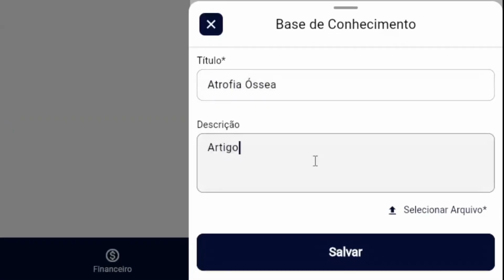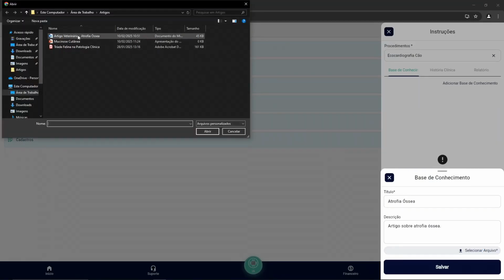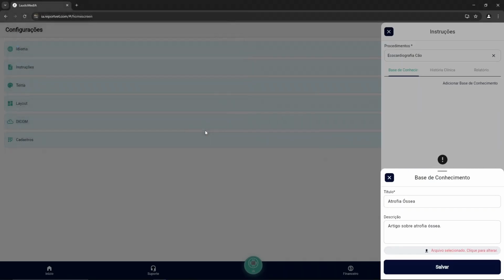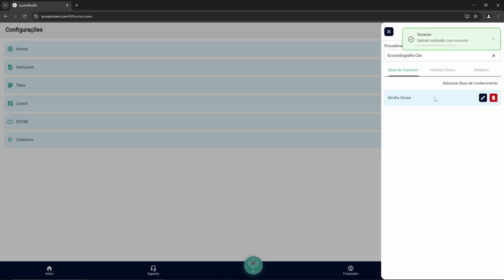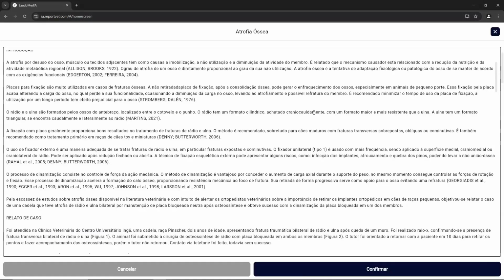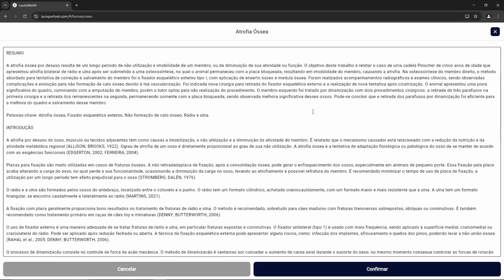You can provide scientific documents as a reference, allowing Lumini to study them and generate reports based on the information contained within these documents. You can import files such as Word, PDF, images, PowerPoint, or any document containing the information you want Lumini to learn. The document's content will be imported into the system, and Lumini will conduct an academic analysis to assist in generating reports.